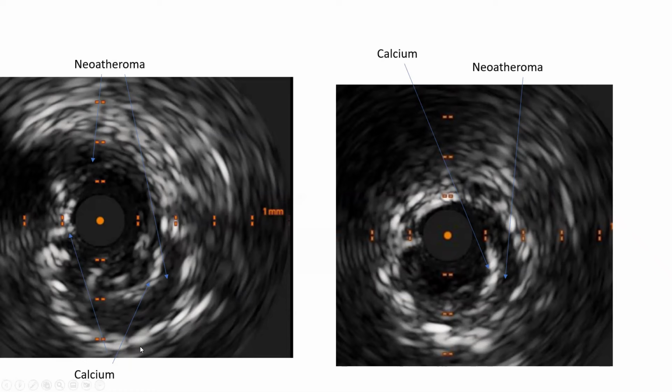So these are the stents here. You see them? Then inside them, you see that neoatheroma. And on top of the neoatheroma, you see those white specks of calcium. So neoatheroma here, specks of calcium, calcified neoatheroma. This is more proximally in the stent. Again, you see the stents here, 2 stent layers. You may not see the two stent layers over the whole circumference, but we're seeing them in some places. Inside them, you see neoatheroma, soft portion, and calcified portion.